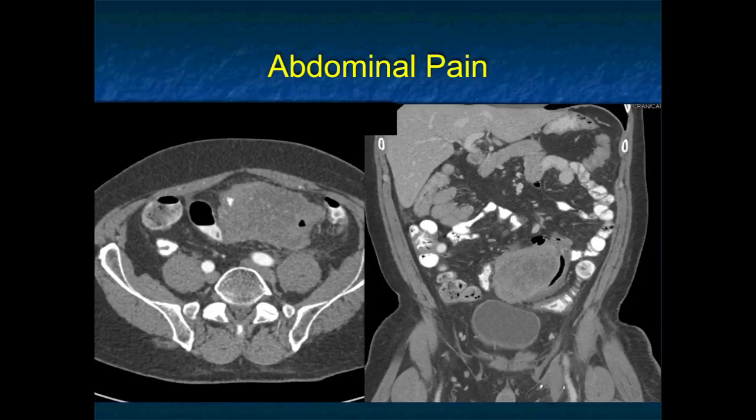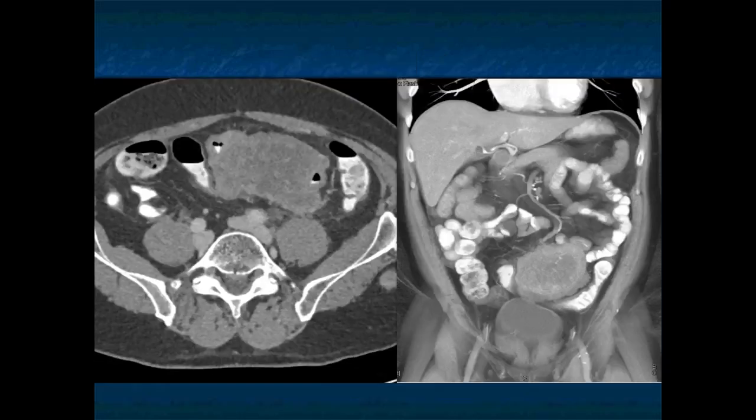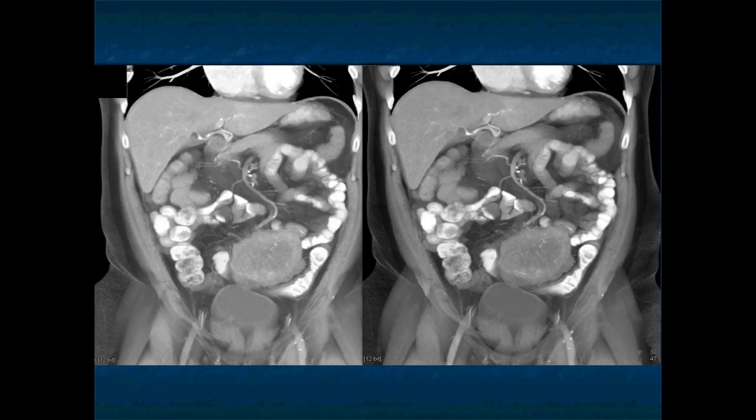Abdominal pain. There's a large mass involving small bowel, which is exophytic. The best diagnosis should be a GIST tumor. We'll look at it again. The small bowel is not dilated, not obstructed, but there's a large mass. So you could think about lymphoma, adenocarcinoma, could be a GIST tumor, and I probably would pick GIST because it's eccentric. GISTs are commonly eccentric, which is why it's not obstructing. But yes, it could be lymphoma, could be a primary tumor, or it could be metastasis.